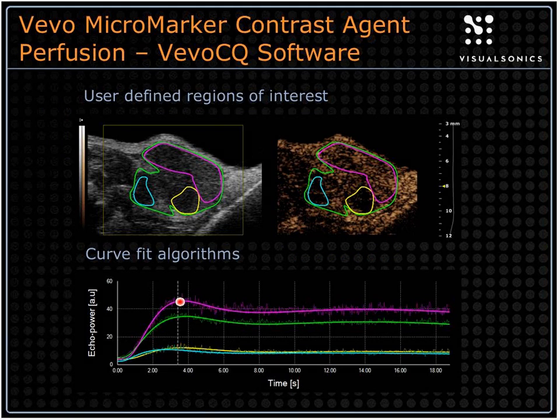So if we look on the screen here, we've hit this peak in purple here in this highly perfused region, and then the signal drops off a little bit and then stays at a constant circulating level. This is a standard model of perfusion. For some of the analyses that you're doing, things like rise time or mean transit time, the software is anticipating being able to capture this rise, this peak plateau level, and then this drop off.